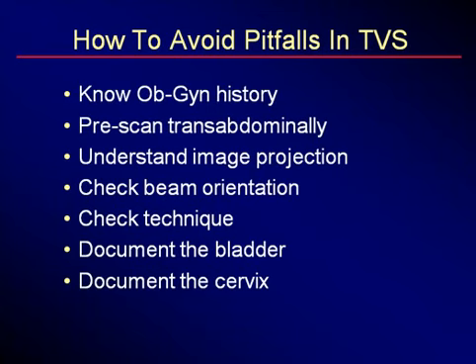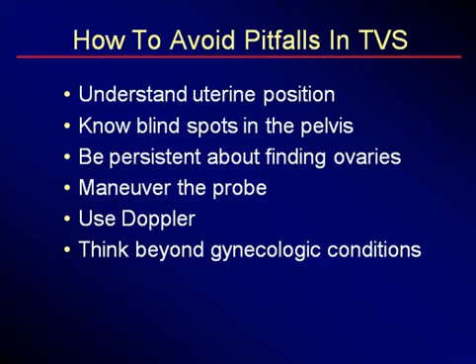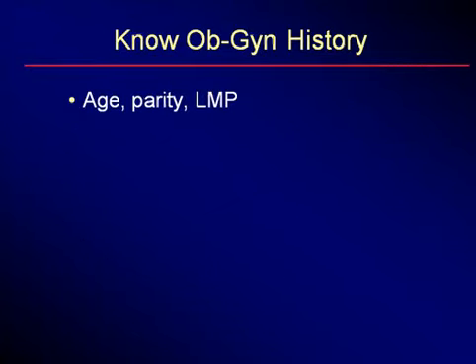Then as you scan, start with the bladder, the cervix, the uterus itself. Know the blind spots in the pelvis. Be persistent about finding ovaries. Maneuver the probe in different ways. Use Doppler at the end, and think of things beyond gynecologic conditions. All of these in a stepwise fashion we will discuss here in this talk.